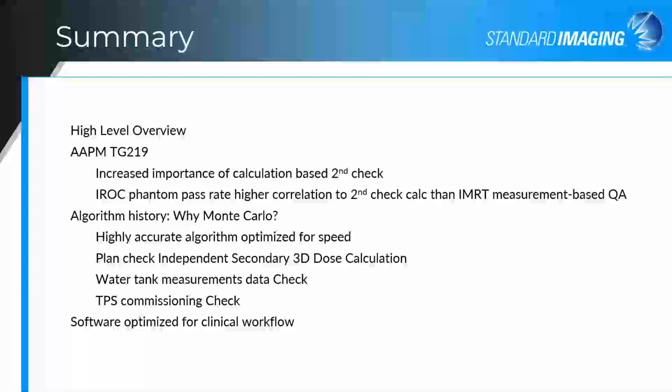The plan check independent secondary 3D dose calculation is very important as well. As important also is the water tank measurement data check as part of the beam modeling, and the treatment planning system commissioning check as well for those parameters such as your DLG. And the software is optimized for clinical workflow.